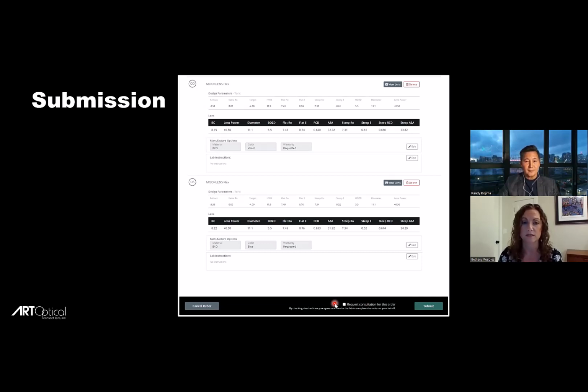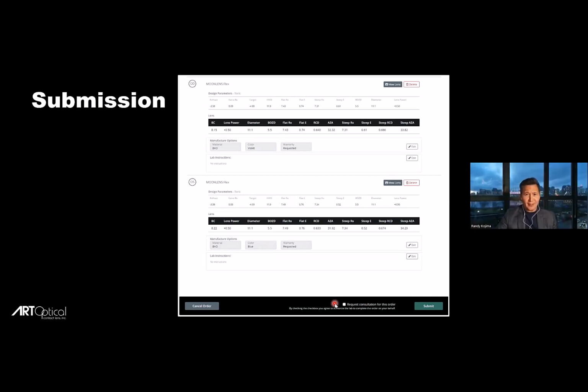So it is kind of nice that we can communicate all within this platform. So we're not having to go to a separate email and communicate with each of the practitioners. We can just do it all in this one database. Nice for the practitioners to be able to have the second set of eyes and have the expert eyes at Art Optical have a look at it. So that's one that you might use with some frequency as you get started. As Bethany said, nice to have that backup in the beginning.